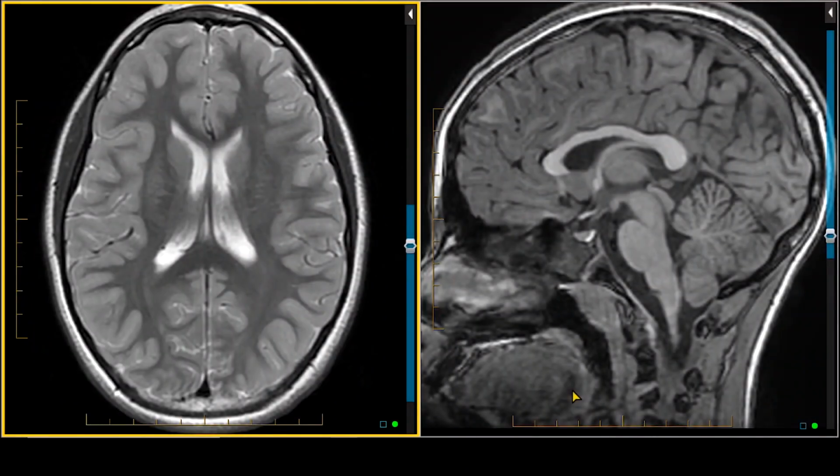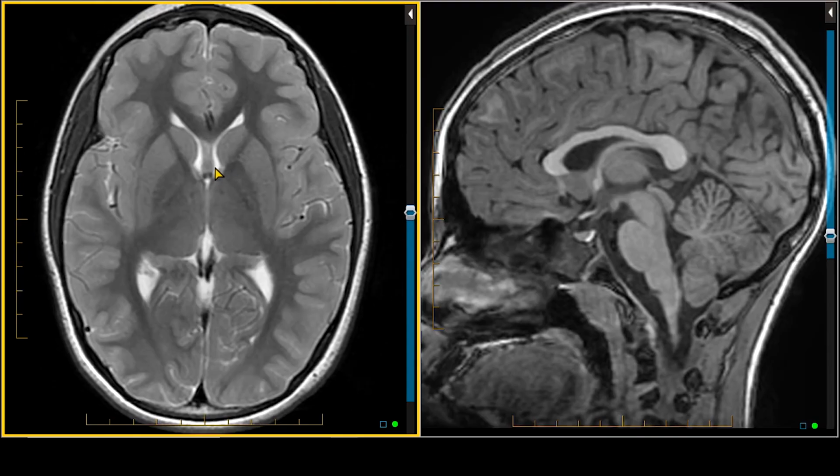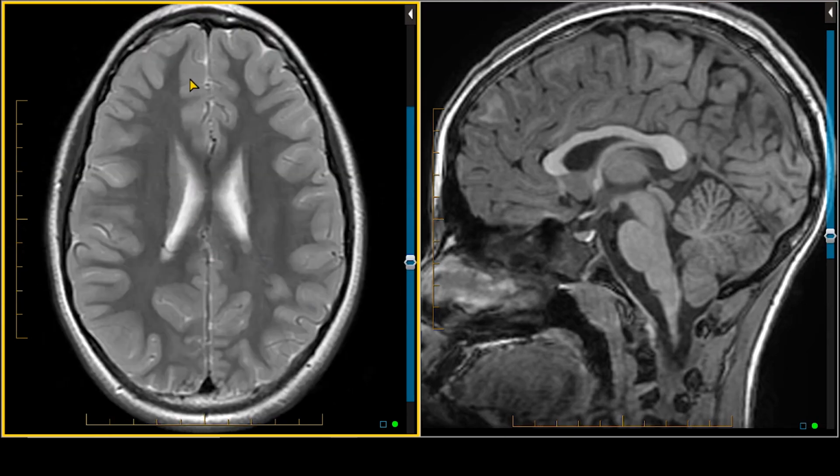This is an MRI of the brain in a 9.5-year-old child with headaches. And at first glance, everything looks normal. In a normal MRI, I look for the size and symmetry of the lateral ventricles. The lateral ventricles look normal size and appropriate morphology and symmetry. Third ventricle, fourth ventricle. At this age, we're seeing near complete to complete myelination, where on T2 weighted imaging, everything looks hypointense for the myelinated white matter.